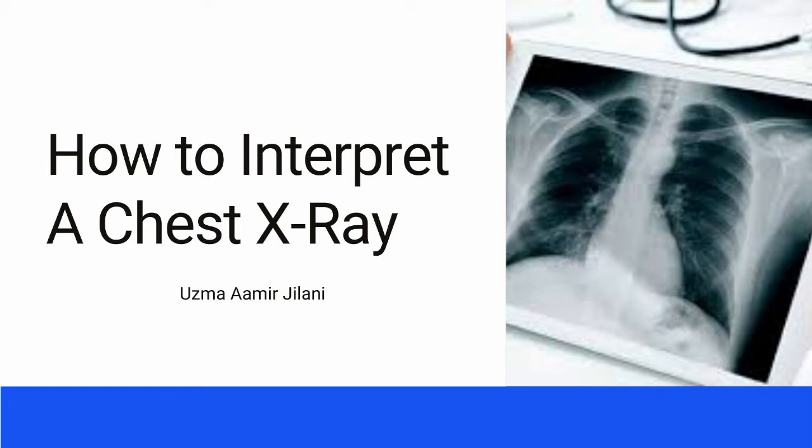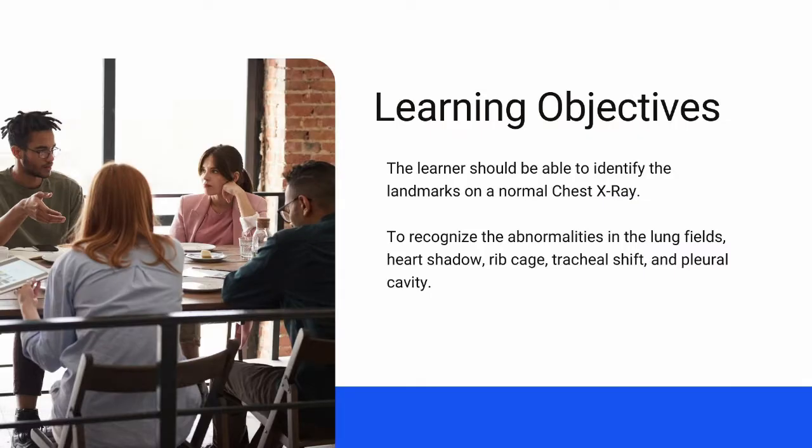Today I will show you how to interpret a chest X-ray. In this video lecture, you will learn about the normal anatomical landmarks visible on a chest X-ray and interpretation of some common abnormal findings that helps in diagnosing a case.